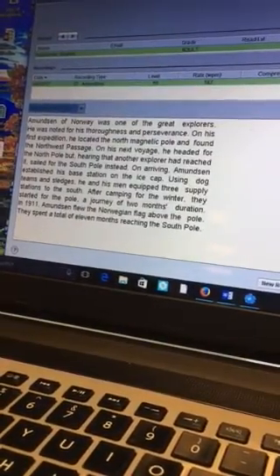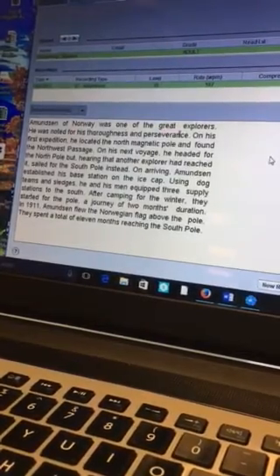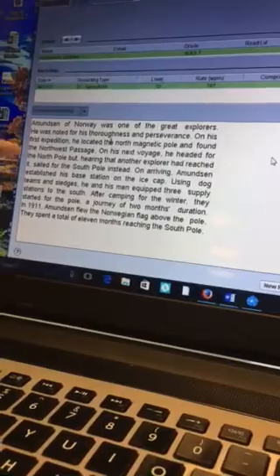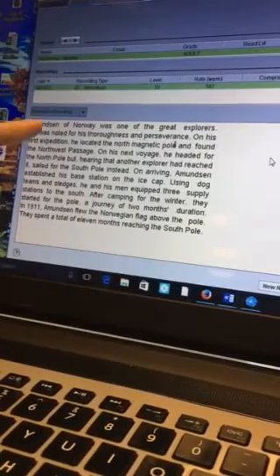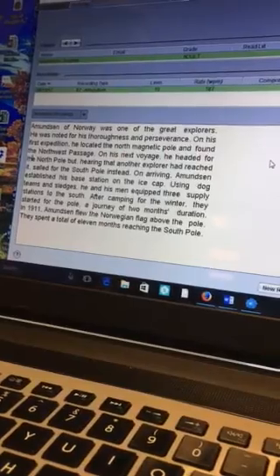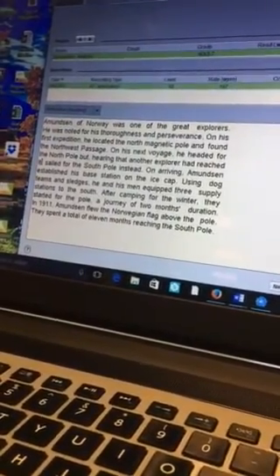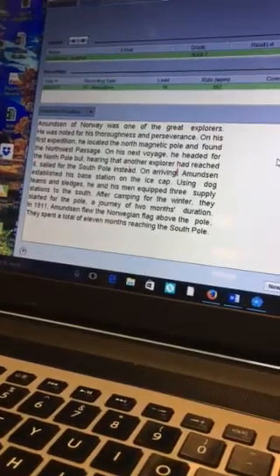So again, your son was reading a 10th grade passage. The red line is showing us where his eyes paused. So that was a great saccade, that movement where you land in the beginning of the line. That one we see he landed towards the end of the line and had to jump backwards. We saw a little bit of back and forth. That back and forth is really going to interfere with comprehension.